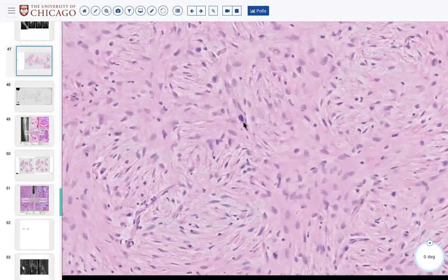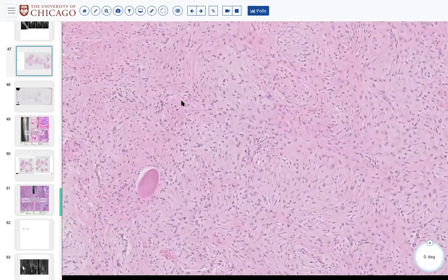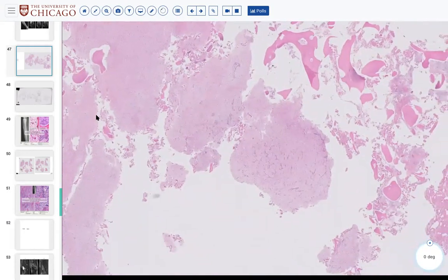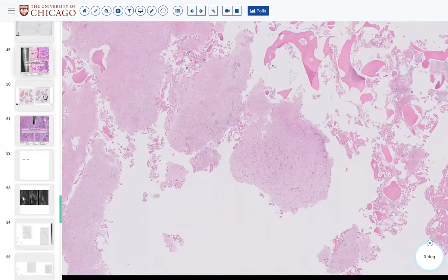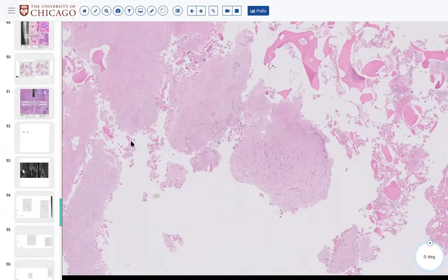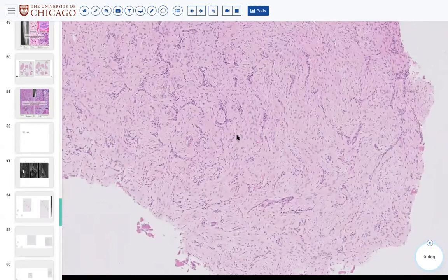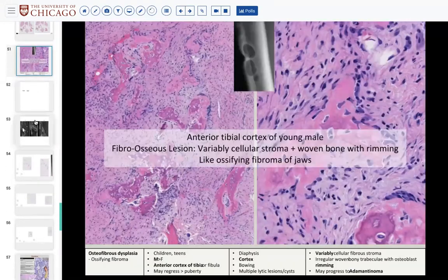There they are. Now that we know they're there, we can see them, these epithelial islands. So if you have what you think is an osteofibrous dysplasia, maybe just throw a keratin on it, because there's very much a histologic spectrum between OFD and adamantinoma. So hopefully that was helpful. These are not common tumors, these are rare, but knowing that they exist and knowing how to work them up, I think is useful. Questions, comments?